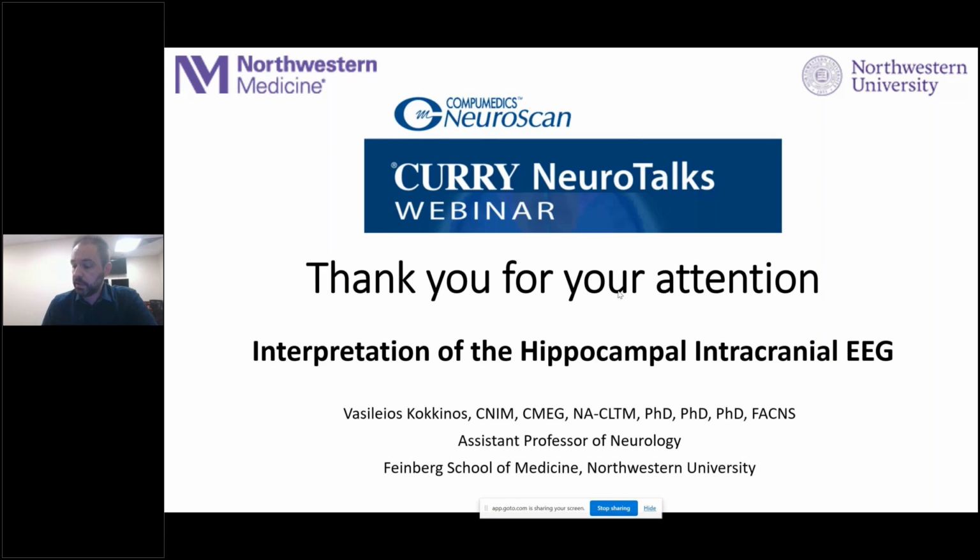So we're covering the temporal pole, the amygdala, the anterior hippocampus, the tail of the hippocampus, and then some groups prefer a basal temporal electrode just for posterior coverage. That would be a standard implantation for that syndrome.